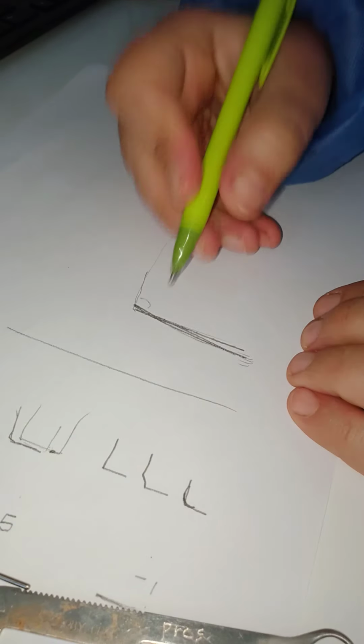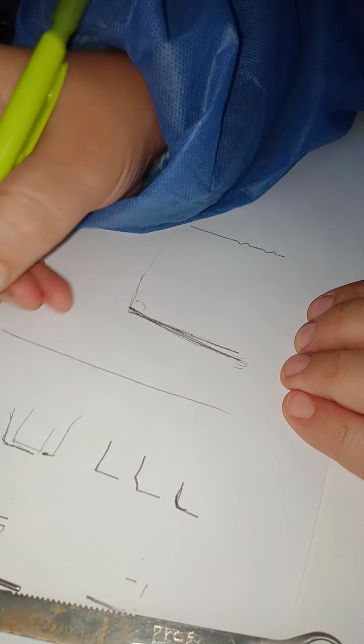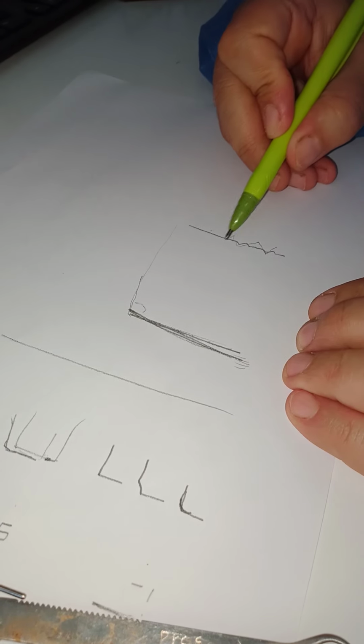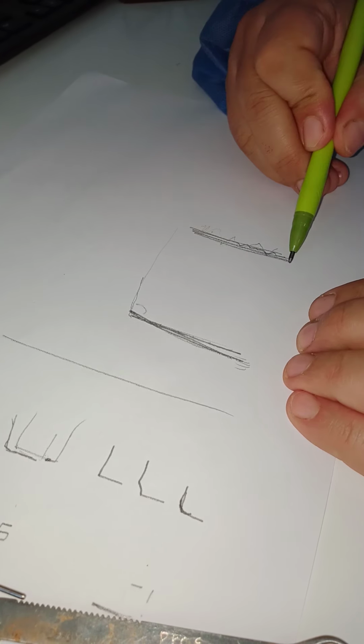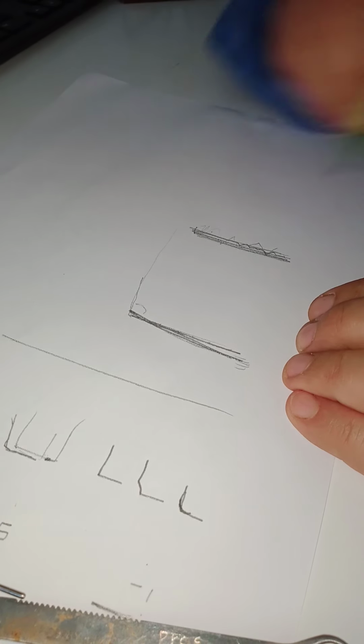My second problem is that sometimes it's rough. Where does the roughness come from? You're using a small bur with a large shoulder, so it comes deeper here, shallower here, deeper here. You're not consistent with your motion. Okay? So make sure when you finish that you use a bur that is wide enough and has a flat end with which you will finish this.